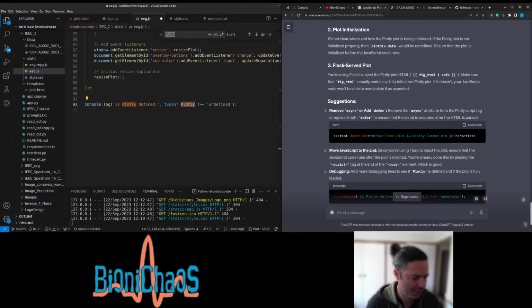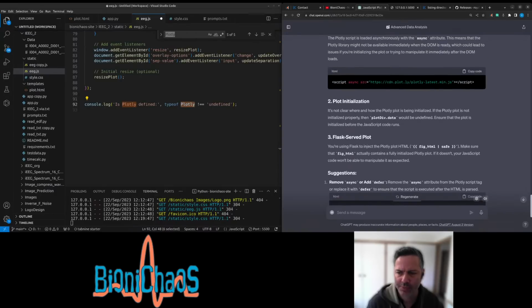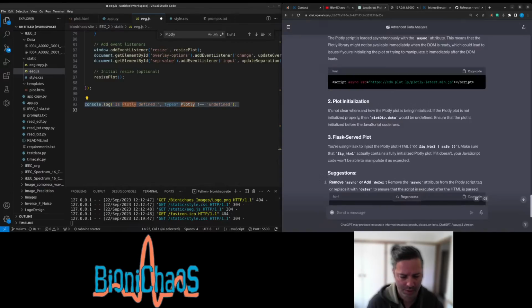What just happened with the text to speech, but yes, we have a Flask. So it does say undefined, plot if data undefined. Why do I add this line? Where do I place this line?